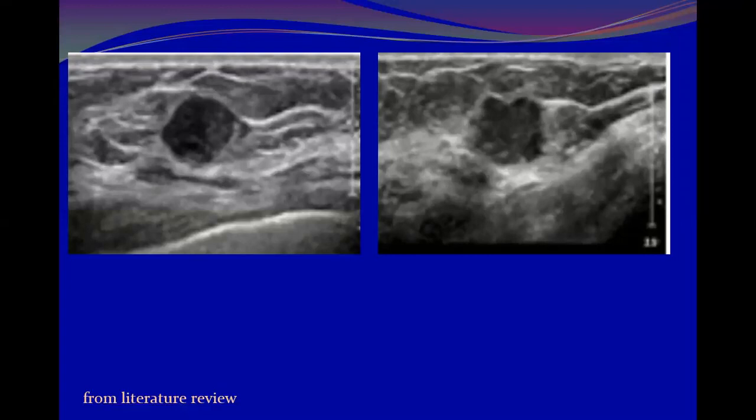On the left one, it is microlobulated, with a partially indistinct margin, representing 4B. Which one? On the left one. This one? No. This one? Yes. Partially indistinct lesion on the right, on the lateral side. Microlobulated. Where is the microlobulation? It has more than one lobule. Sorry, microlobulated. What about this one? This has an irregular margin, microlobulated.